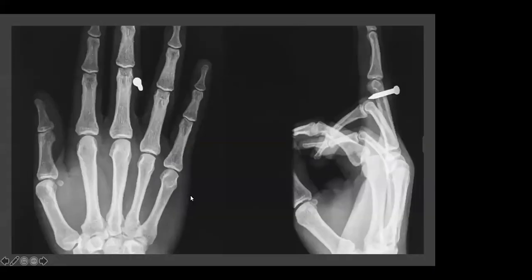So we've seen examples of soft tissue swelling and joint effusions. The other part of the S section of our acronym is looking at foreign body. Very common cases you'll see as a junior doctor will be requests for imaging saying the patient has a dog bite, query foreign body, query bony injury. And foreign bodies are typically radiopaque, so they're very easy to spot on imaging.